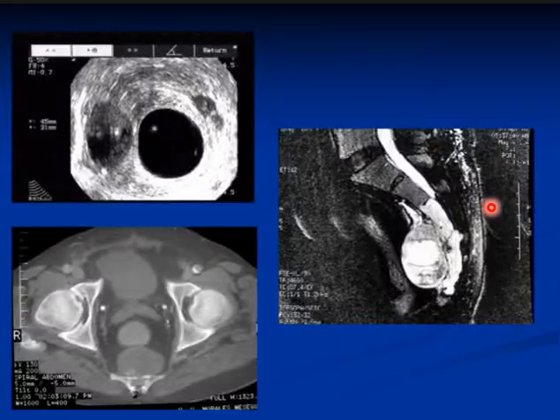Yalla Jinan. So, what do you see here, Jinan? Exactly, that's what I'm asking. Excellent. Rectal ultrasound showing a well-defined mixed echogenicity lesion at the side of the rectum.